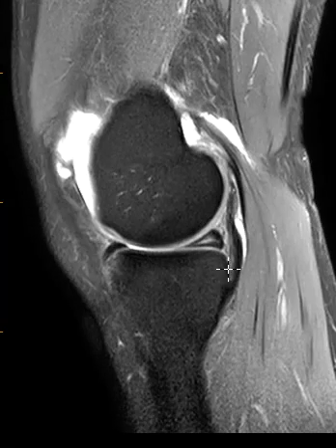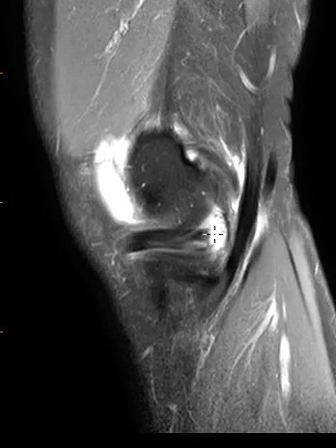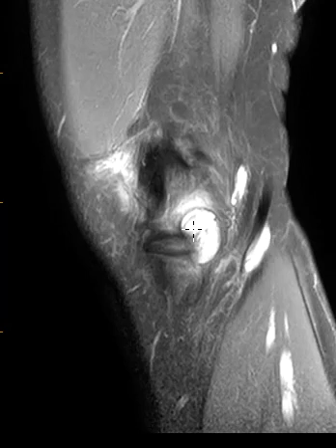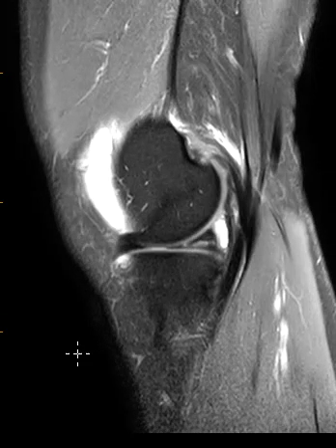And when you see these, the surgeon may want to go in there and take down the cyst and also repair the meniscus, because if they don't repair the meniscus, it'll just weep out into another cyst. So that's it, a parameniscal cyst of the medial joint line associated with an intrasubstance horizontal tear of the medial meniscus.